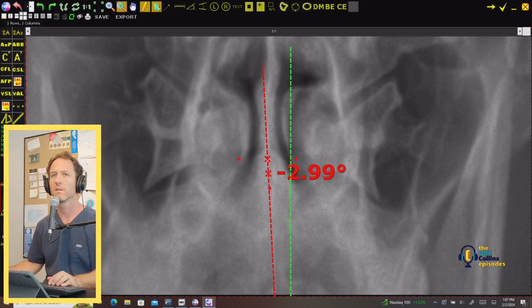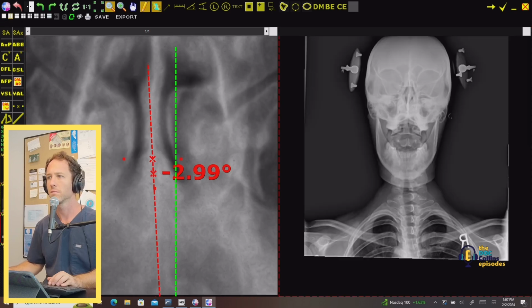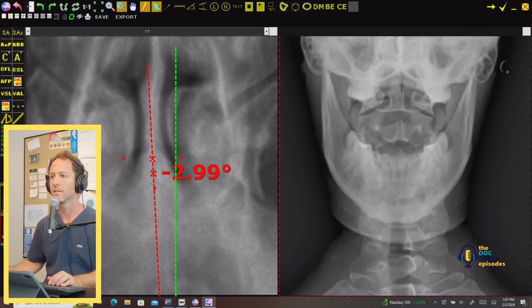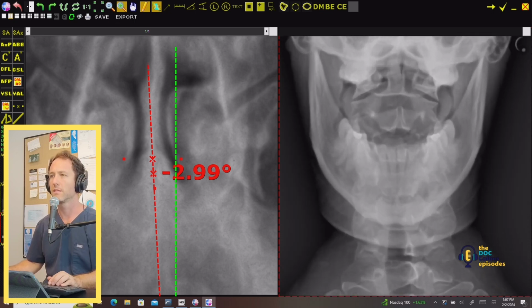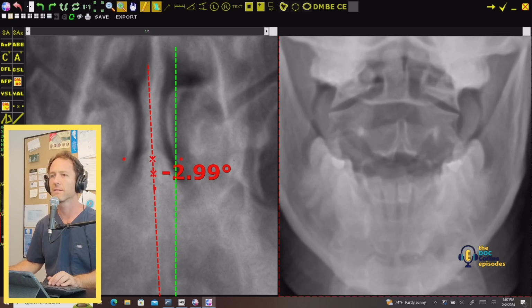And I think probably the best reference tool here is going to be to bring up your axial view, which is a real blessing, and to have a reference like this. And we have a practice, I'm sure it's in other techniques, but in AdvO, that is called dimensional transpositioning.